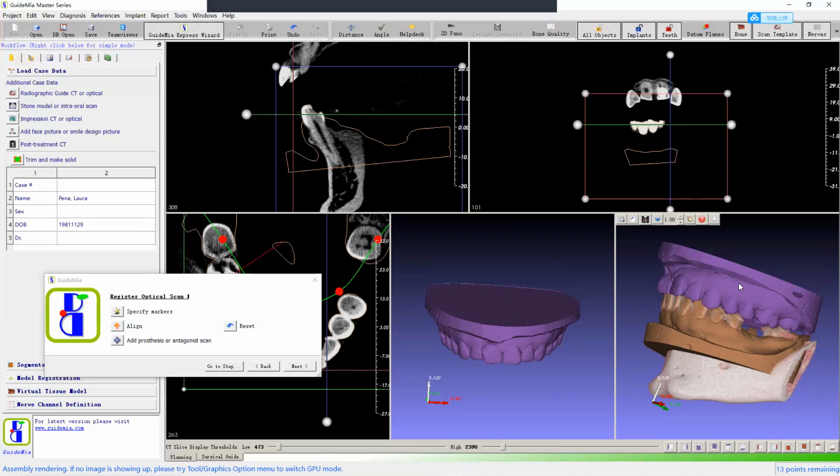For this case, the operator scan just follows the lower jaw. So once we scan the upper and lower and scan a bite, which we typically do, that gets saved. Once we send the STL of both, and you import the two, it would immediately put them into the occlusion that you captured on your intraoral scan. Exactly.